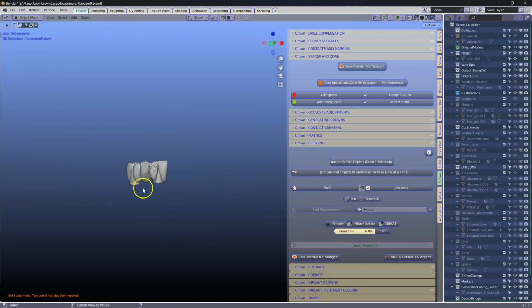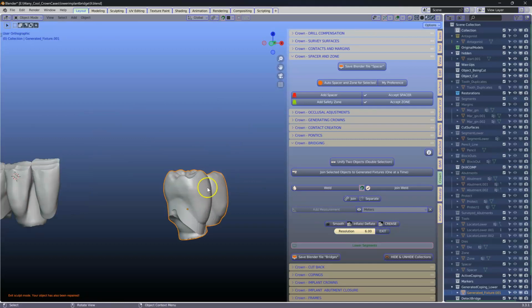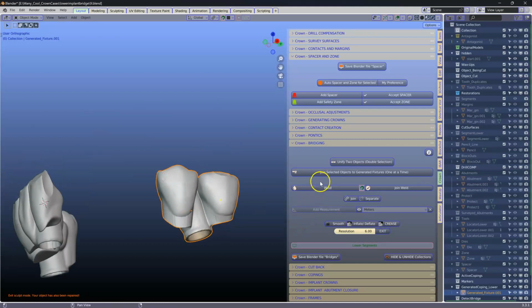Go to your other one, Alt H, do exactly the same thing, smooth it.